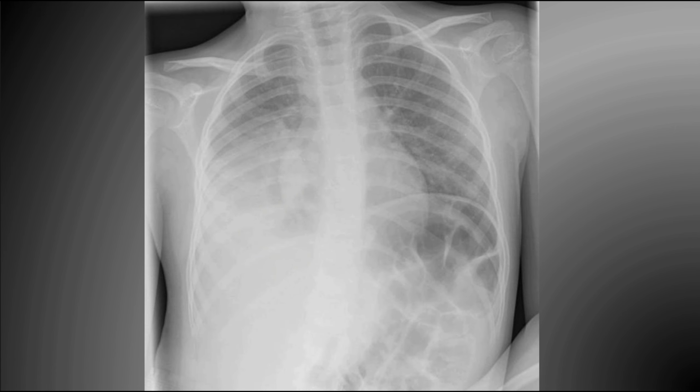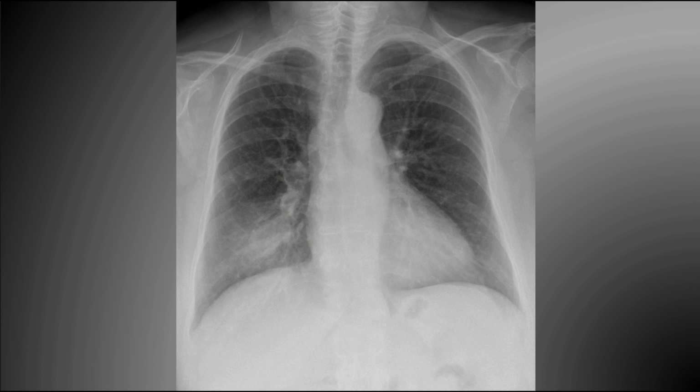What about this picture? There is dense opacification in the right lung, but I'm going to color in the abnormality. And there it is. And this is right lower lobe consolidation. I'm convinced that it's the right lower lobe because I can see the entire right heart silhouette. This is another case, believe it or not, of right lower lobe consolidation, and you can see some air bronchograms there as well.